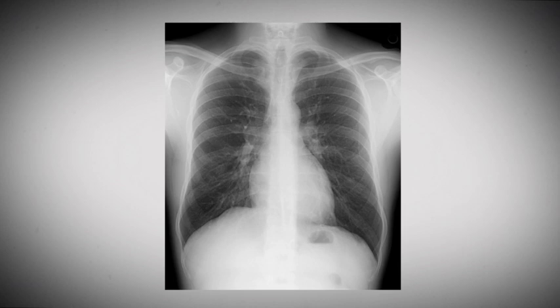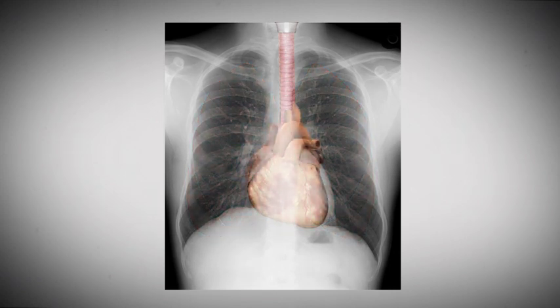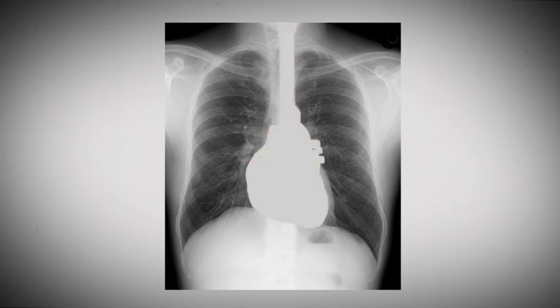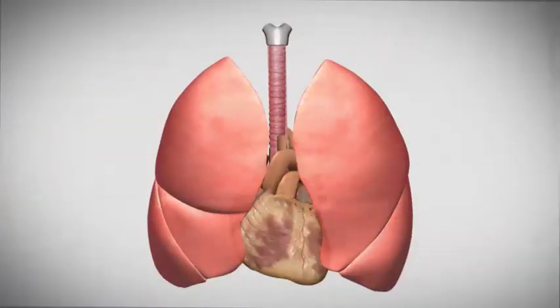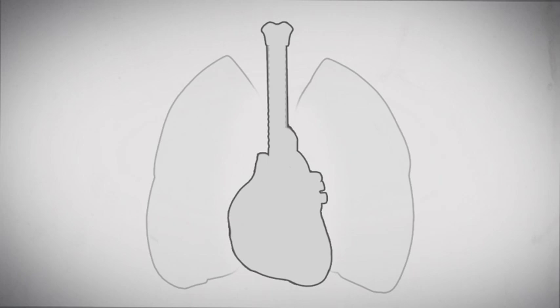The organs of the thoracic cavity comprising the mediastinum share a similar radiographic density. The heart and its great vessels, the esophagus and trachea of the central chest, and their borders blend to form a characteristic central silhouette on the radiograph. This schematic depicts the central silhouette formed by the mediastinum.